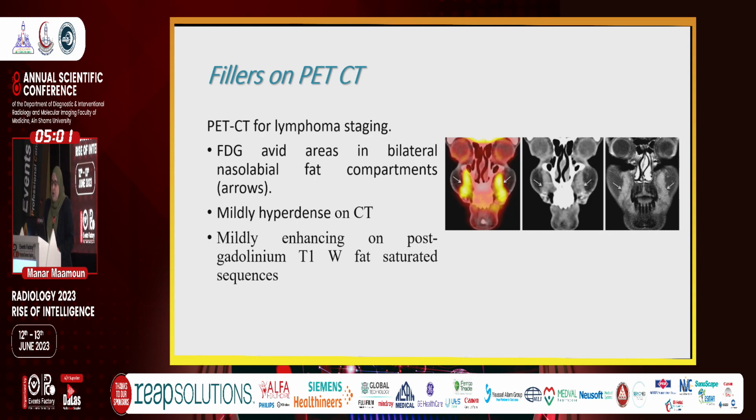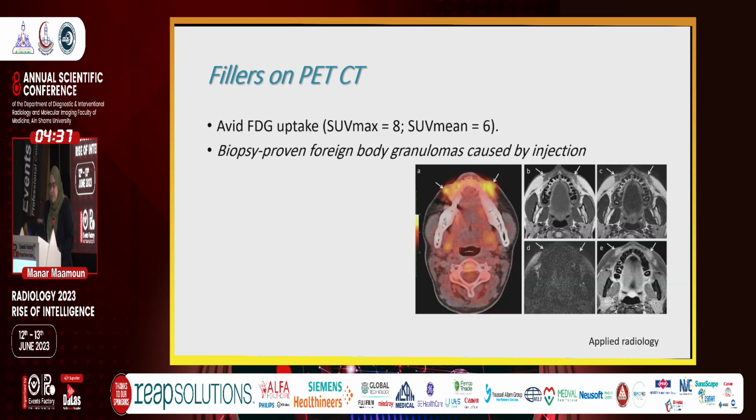Fillers are not evaluated by PET-CT, but you can find them as an incidental finding, and they could be misinterpreted because many fillers have a normal high FDG avidity. So go back to the cross-sectional images. You will find them in their typical anatomic locations and with their expected imaging appearance. Here is another high FDG avid filler, yet it forms mass-like lesions, and it was pathologically proven to be foreign body granulomas.